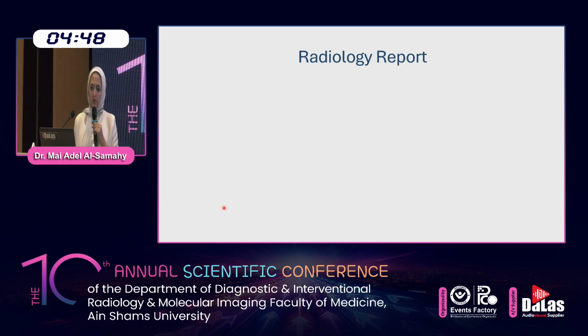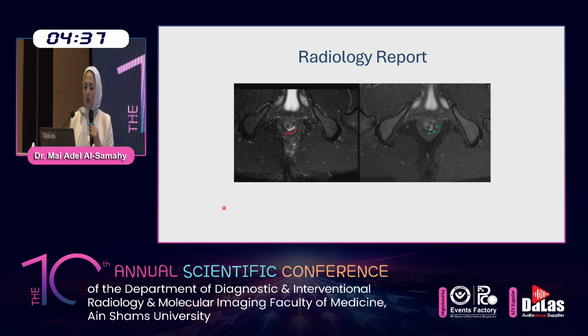So to sum up, to have a take-home message, which I believe could be beneficial, I will give a brief about the points that we should cover in a radiology report. At first, we should state the presence of a tract. We should describe it as active, inactive or chronic. An active tract usually has high signal intensity in both T2 and STIR, unlike a chronic tract where fibrotic hypointense T2 fibers and hypointense STIR fibers are present, as we see here marked by the green arrows.